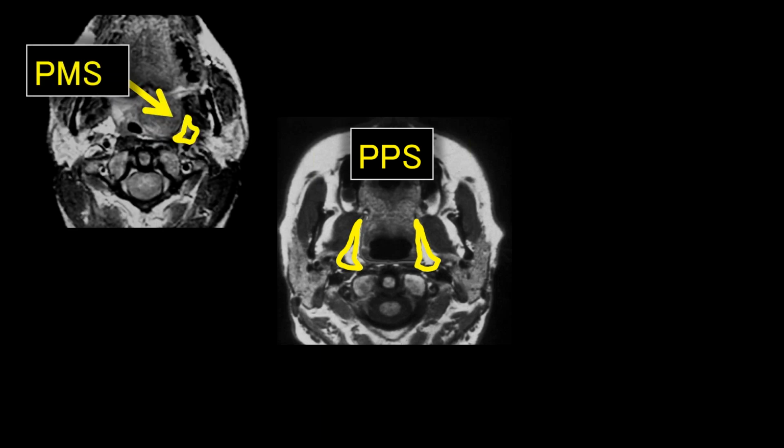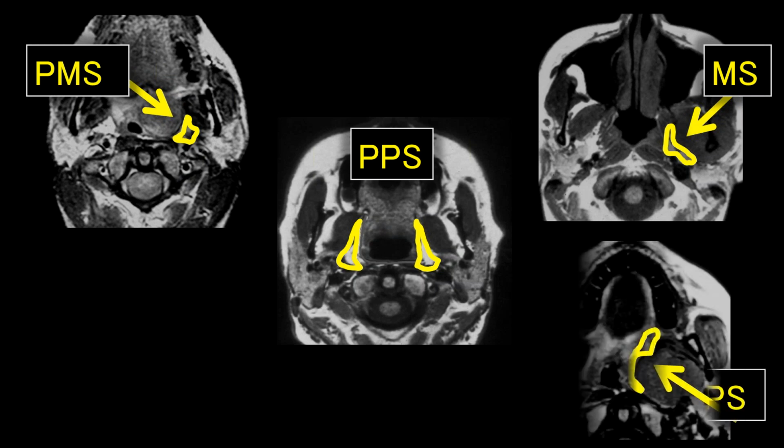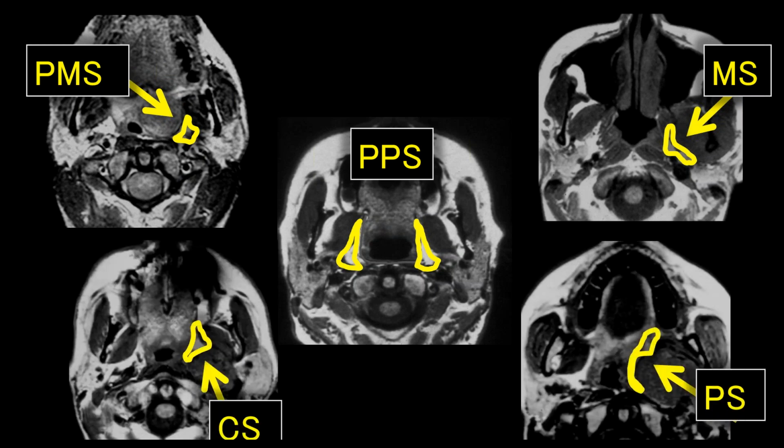And I know if a lesion is arising from the different spaces around that fat, it'll push that parapharyngeal fat in different directions, and that helps me make a space-specific differential. And then I can assign the imaging features to pathology that happens to anatomy of that space. So it's very important that we make a space-specific differential with our imaging diagnoses.